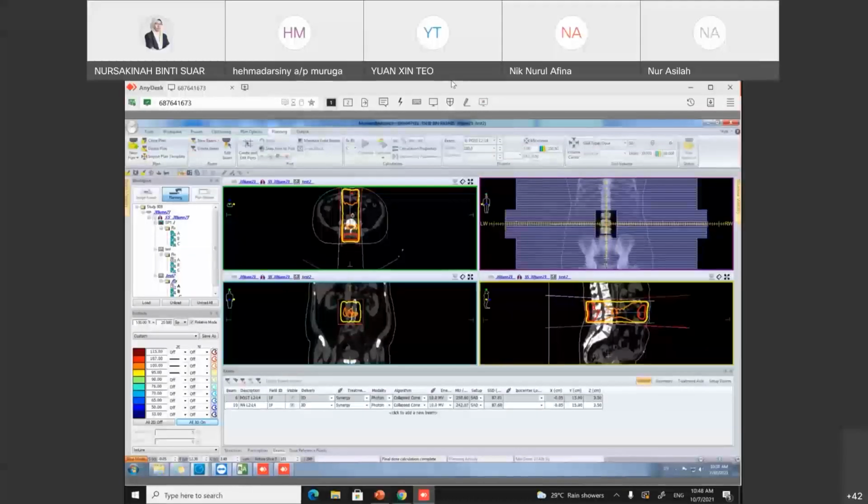Okay, I repeat: what you learn in the theory base, there is beam divergence and penumbra at the edge of the field. So it's very common when you see our beam here. Look at my pointer. The 100% is not covered. It's not fully 100% covered across the whole beam, the field size.